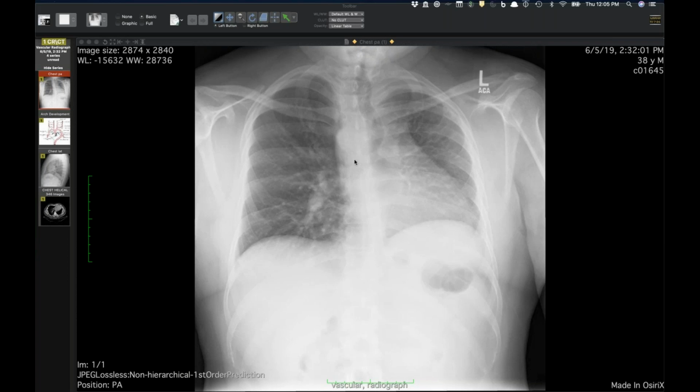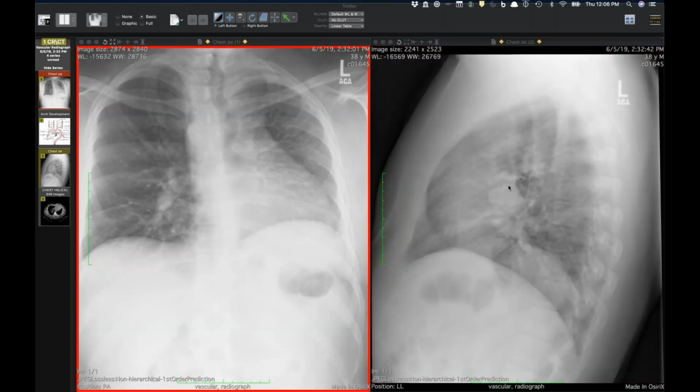And one of the keys here is the right aortic arch. And you don't really see much in terms of a left pulmonary artery. We can look at the lateral view as well, and you'll see a right hilar vascular opacity, but you don't see the typical left pulmonary artery under the aorta. And so whenever you see this in conjunction with the contralateral right-sided arch, this just screams of proximal interruption of the left pulmonary artery.